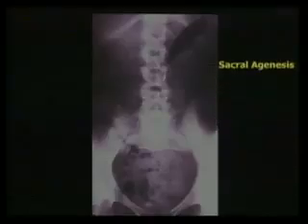Where's my sacrum? There's a lot of stool, but you can always see through it. You can see some of the bone. There's nothing here. Sacral agenesis. This patient's mother might have been diabetic.